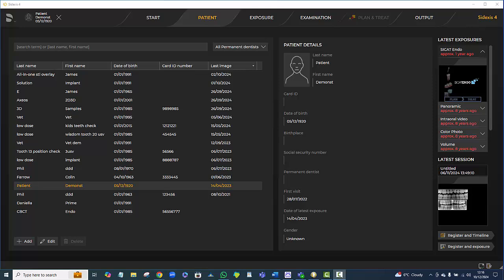This short video explains how to use your OPG in Sidexis 4, specifically for those of you that have upgraded your software recently. So you could add a patient from down here, but don't do that if you're using a link from your practice management software.